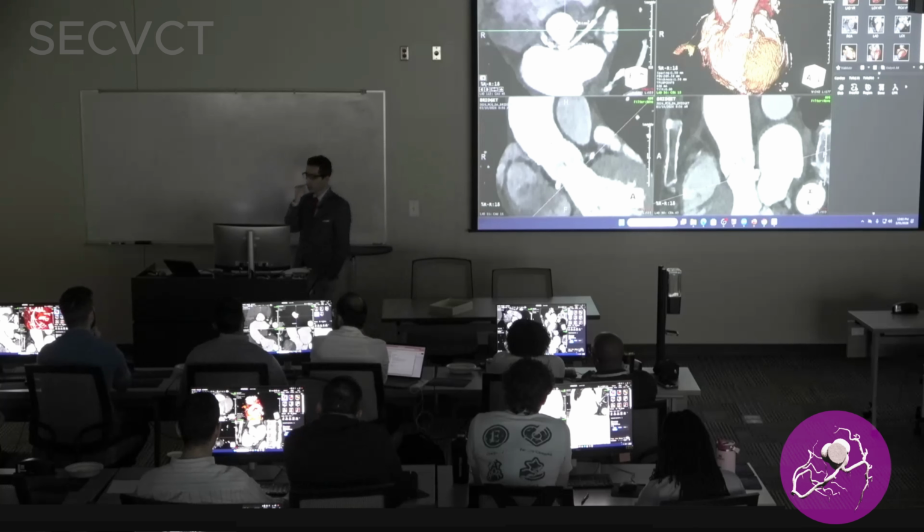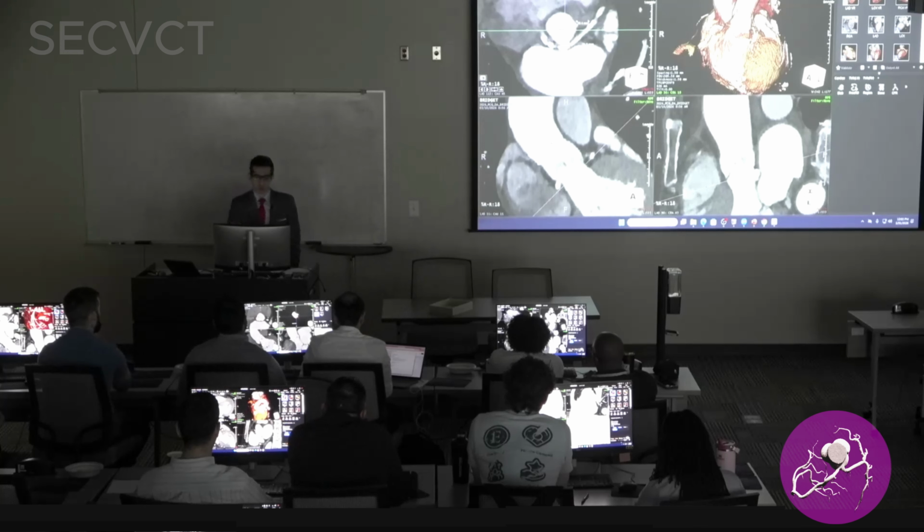So for this patient, we talked to the structural team that we prefer to use maybe an Evolut or self-expandable valve. You're not going to encounter it often, but this is one of the times the retroaortic course matters for the structural cases. Any question about this case?